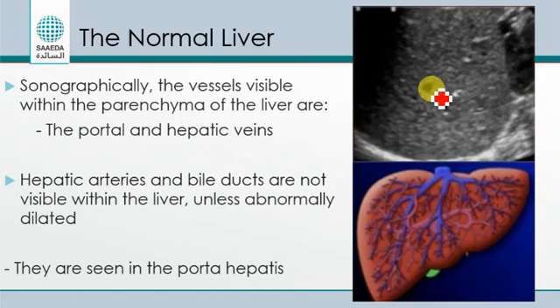The hepatic veins, as we said, usually have no perceptible wall, while the portal veins have a perceptible wall. And why is that? This is because what you see, the echogenic wall, is not only the portal vein, it's the portal triad. There are arteries and biliary ducts accompanying the vein in the surrounding, giving it increased echogenicity, okay? But you don't see them because they're so small.